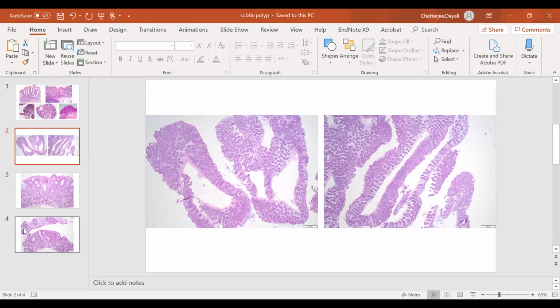Thank you for your comments. The thing is, that orientation problem is really hard when you have to distinguish between a hyperplastic polyp and an SSA lesion. However, as you can see in the lower magnification, a lot of these pieces are still well oriented. All these bigger pieces are very beautifully oriented, and we can say this is the luminal surface and this is where the muscularis mucosae on the inner surface is. Here too, the muscularis mucosae is in fact quite thick, and a lot of these pieces are well oriented.